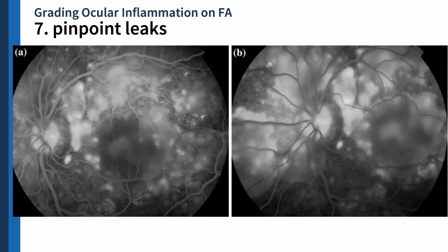Yeah. Okay. So yun. So you take a look at the other features in the angiogram. So if the disc would be normal looking, so medyo mas CSR yun. But as you can see here, the disc is also inflamed. So there's inflammation in the disc also. So this points you more towards an inflammatory etiology. Okay. Of course, you will have the other features like cells and things like that. But just by looking at the angiogram, you already sort of know na, okay, parang baka may inflammation going on here.